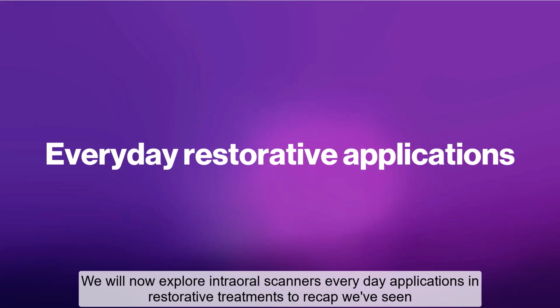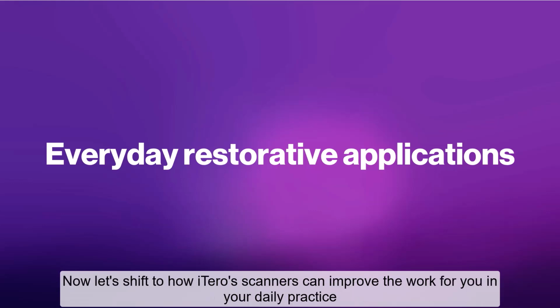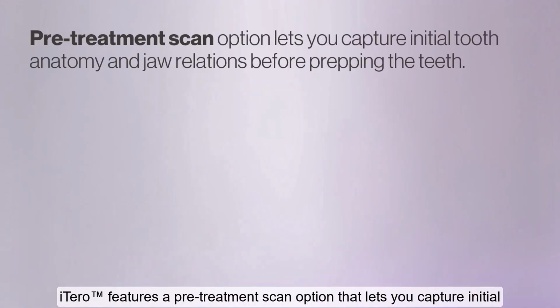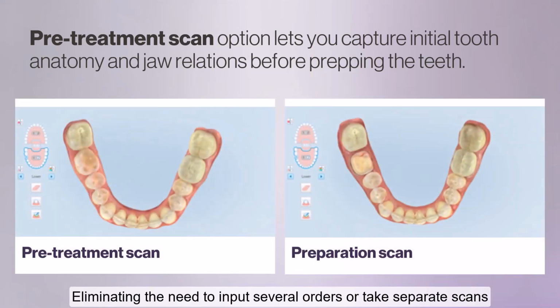To recap, we've seen the benefits of digital workflows, such as improved processes, treatment outcomes, and superior accuracy. Now, let's shift to how iTero scanners can improve the work for you in your daily practice. iTero features a pre-treatment scan option that lets you capture initial tooth anatomy and jaw relations before prepping the teeth. Later, both scans will be shared with your lab simultaneously, eliminating the need to input several orders or take separate scans.